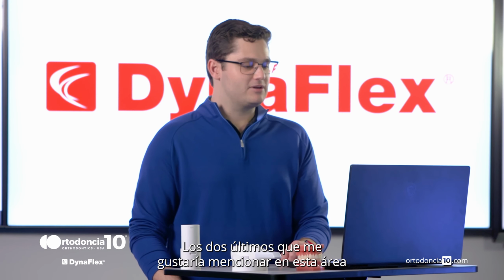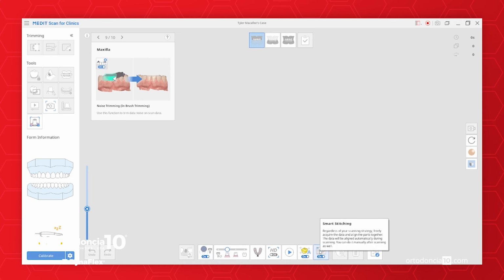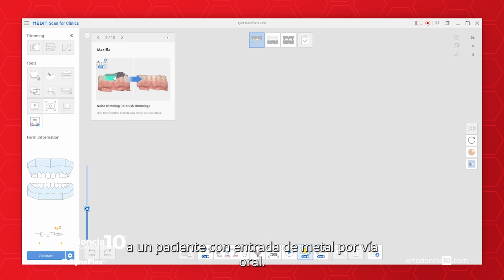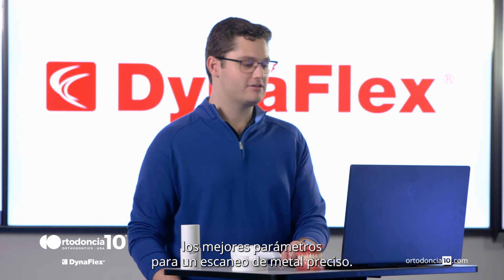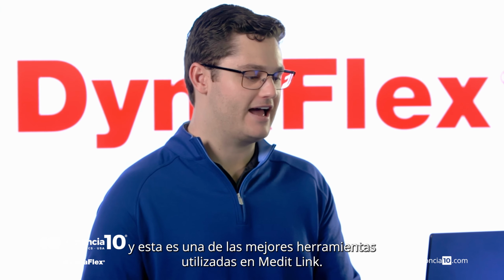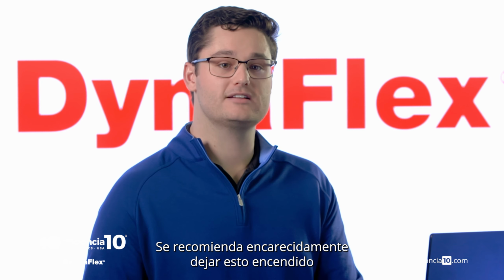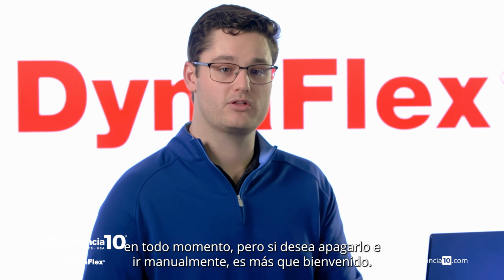The last two I'd like to mention in this area are the metal scan feature and the smart stitching feature, one of the most important pieces in MEDIT. The former you must turn on if you intend on scanning a patient with metal intraorally. This allows the AI to automatically apply the best parameters for an accurate metal scan. The smart stitching feature has equally powerful AI, and this is one of the greatest tools used in MEDIT. It is highly recommended to leave this on at all times, but if you'd like to turn it off and go manual, you are more than welcome to.